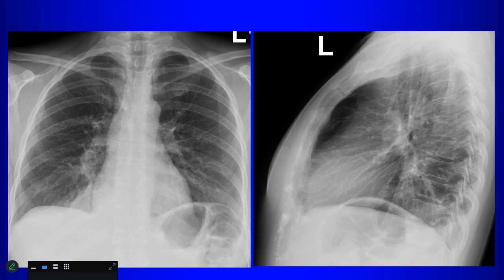Do you see both diaphragms on the lateral view? Especially posteriorly. Which one's missing? Right. The right. So what are you going to do now? Look at the frontal to see. Look at the frontal, and do you notice anything? The opacity right over the right diaphragm. There's an opacity here, right? And this diaphragm, that right diaphragm back here, is obscured.